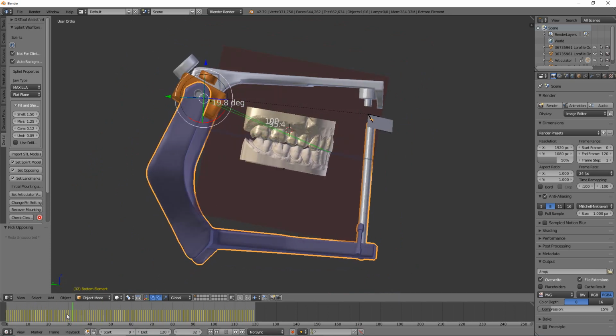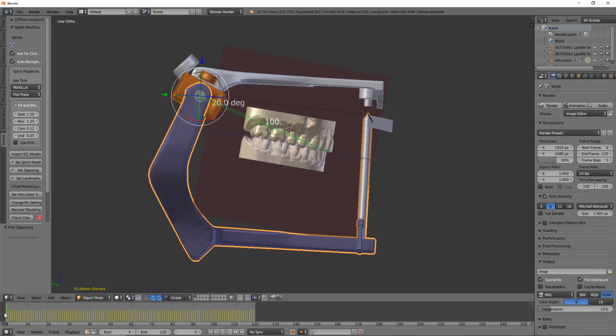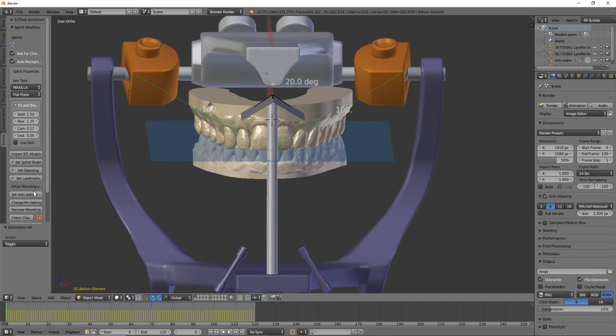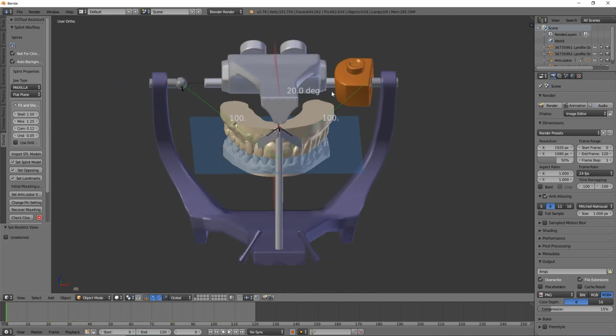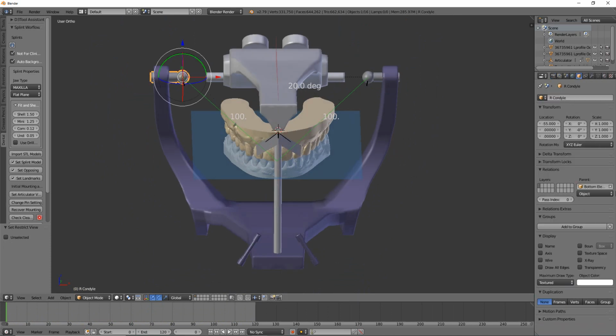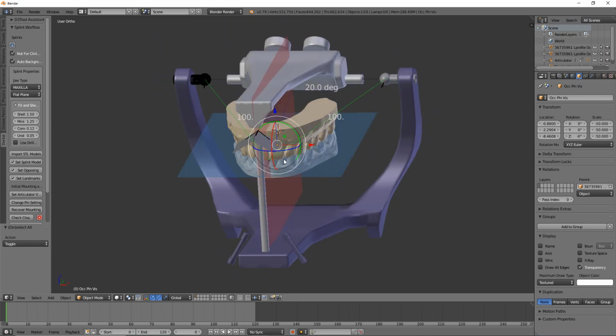So we've still got the same, you can slide the timeline here and preview the animation. We can still change the pin, but let me hide a few things and show you a few slight enhancements that are some enhancements to the mechanics of this articulator.